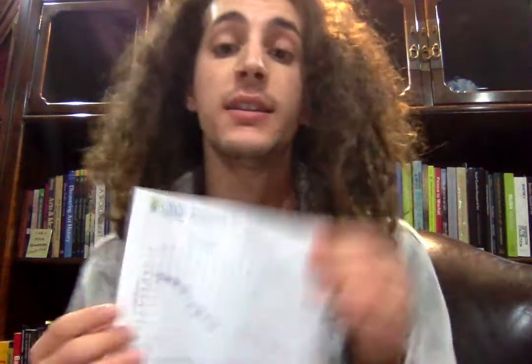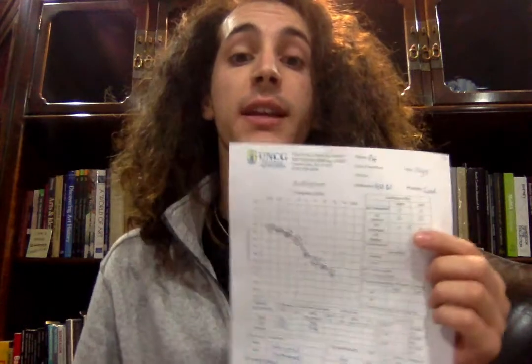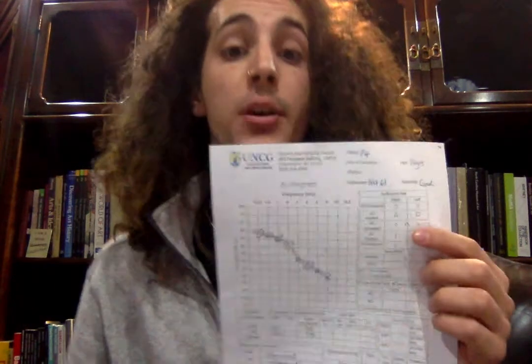The type of loss is sensory neural, and that's because these are matched very closely to each other. So what this might be able to tell us is that this patient is presenting with presbycusis. Presbycusis is a pretty natural phenomenon that happens, and it is due to the aging of the auditory system. So as people become older, they lose some high frequency hearing abilities, and thus are resulting in some sensory neural loss.